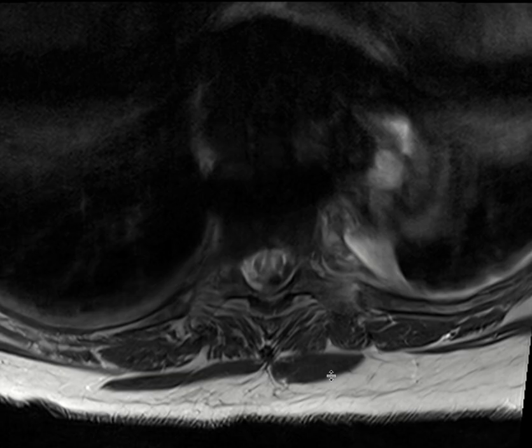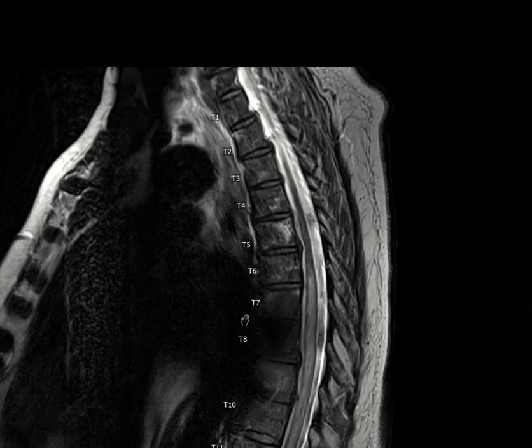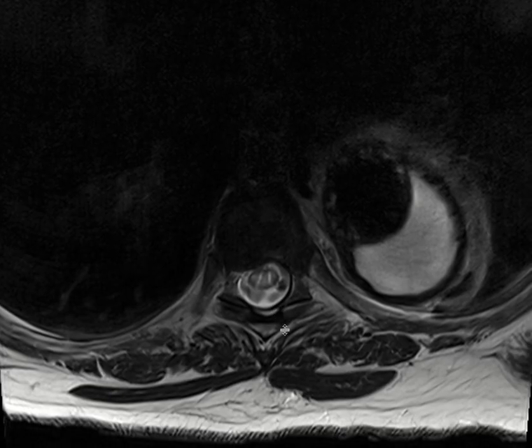But just remember that, like in the brain, we should have some sort of vascular supply compromise to have cord infarct. So the hallmark is non-enhancing, expansile, abnormal cord signal that has restricted diffusion, if you are able to get a good DWI and ADC, and then it's going to have the owl sign in the cord, which is the hallmark for cord infarct.